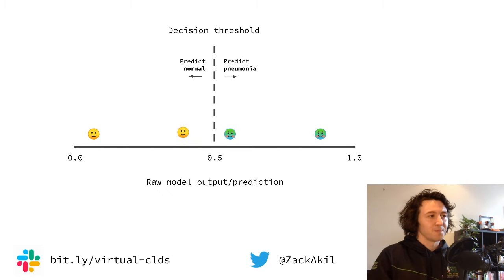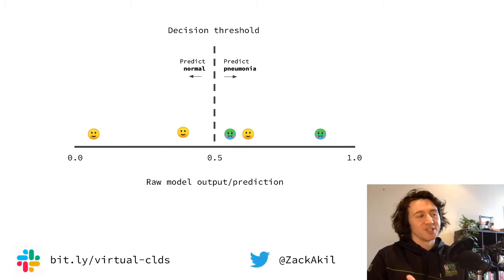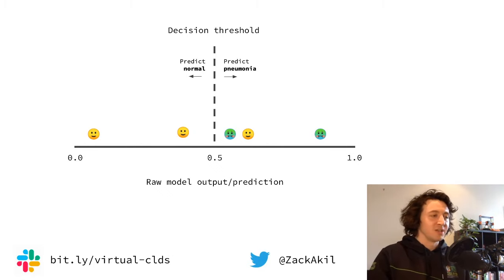This one also close. You can imagine then we might get some wrong. This one, there was a bit of noise in the data. The training didn't go on long enough. The model got it a bit wrong. This one got it wrong.